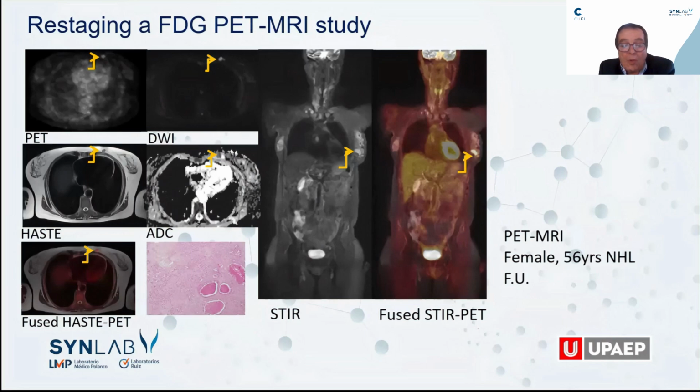In this organ, over the metabolic information derived by PET, MRI gives more detailed morphological information and enhanced diagnostic accuracy of malignancy. In particular, the increased cellularity derived by diffusion-weighted imaging, that you can see in the upper right picture.